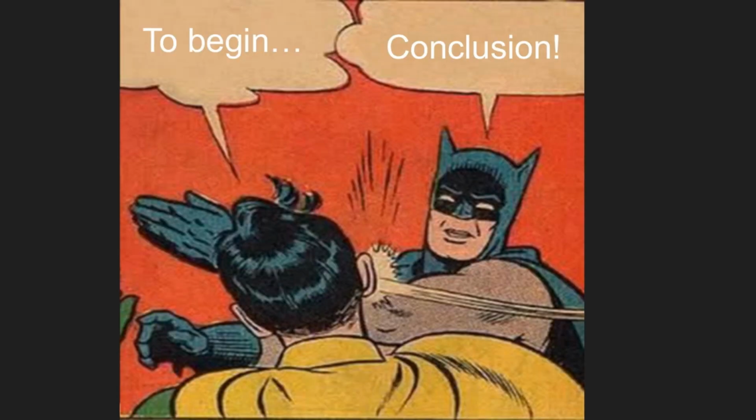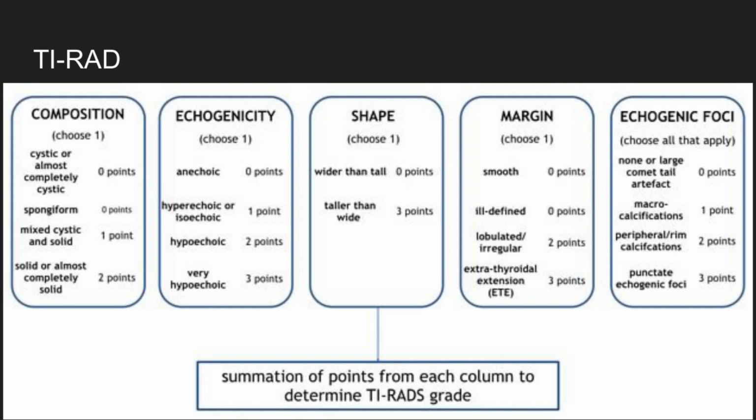Hello everyone, today we'll introduce you to how to interpret thyroid sonography results. To make things simple, we want to focus on whether a mass you found is more likely to be benign or malignant. And because we are very lazy, we will skip through some underlying pathology or theoretic things, just to be more focused on clinical practice. So this episode is merely just to quickly go through the useful TI-RAD tools.